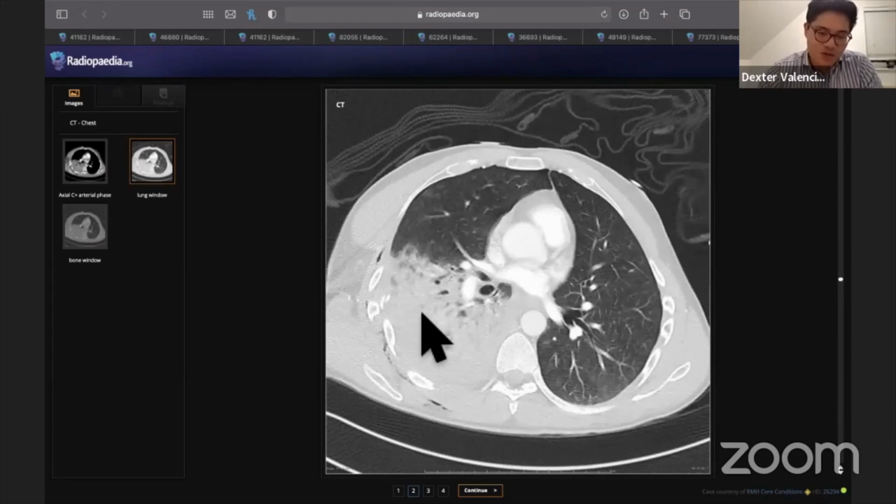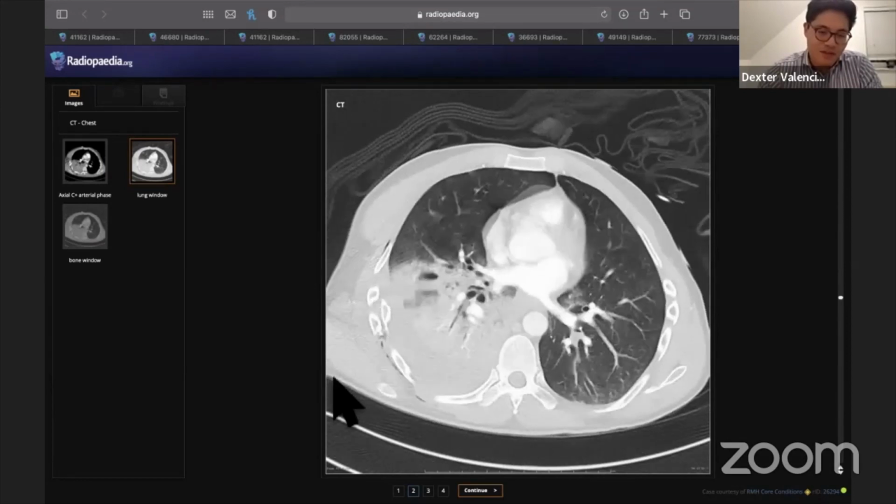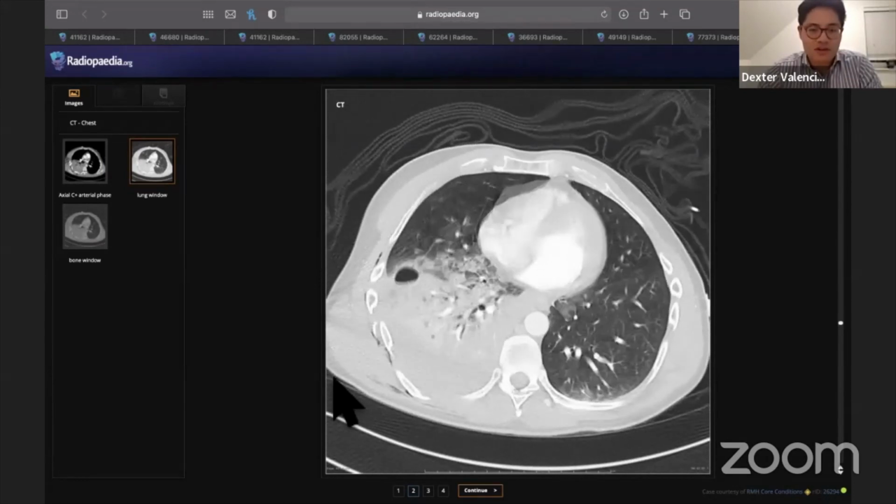If you imagine, can you spot a small lung cancer within all of this? It's near enough impossible. So you would have to advise you get repeat imaging. In this patient who's probably young in a car accident, they're probably not going to have a cancer. I can't see any other signs of malignancy elsewhere. This is all related to trauma in the clinical context. So this patient probably won't need a follow-up scan, because you can say with confidence this is most likely all related to trauma.